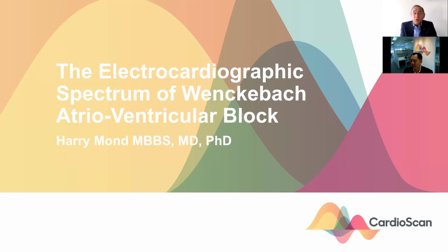It's wonderful to enter the world of Wenckebach block. And we take it for granted that it's just simple looking ECGs. But when we look further into it, we can see a large number of different combinations.